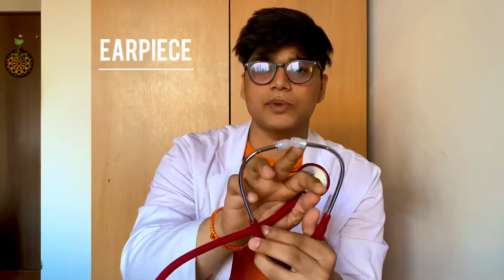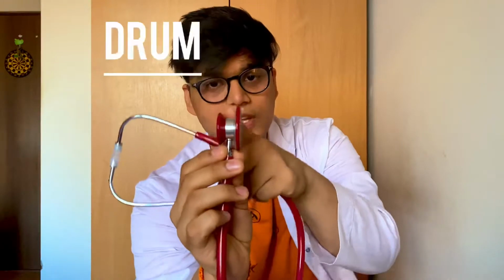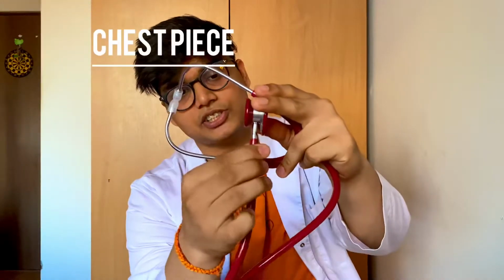This is the earpiece. This part which you can see in silver is binaural. This is the PVC pipe. The bigger diameter is the diaphragm, and this is bell. And between both of them is the drum. This is the chest piece.